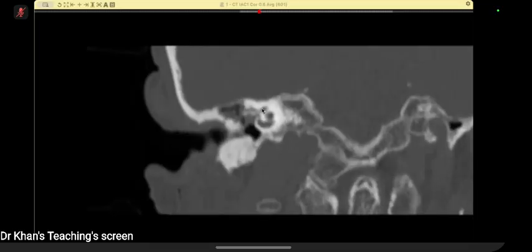Sir, this is the labyrinthine and this is the tympanic. Is it normal? Sir, the tympanic portion is not normal. Thank you.